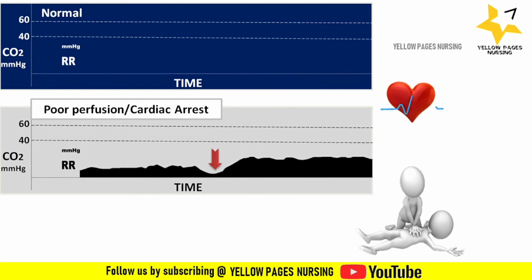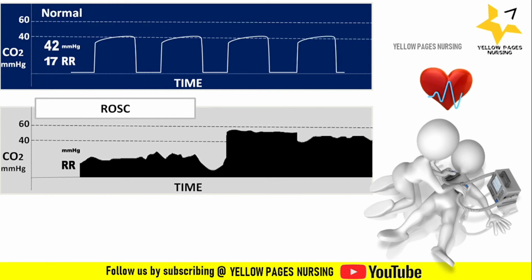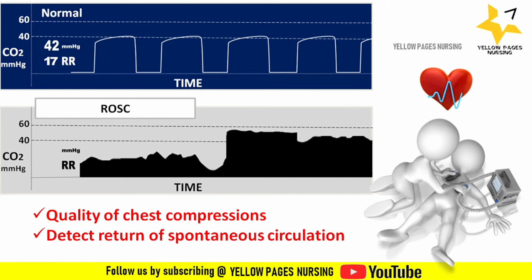Next comes the return of spontaneous circulation waveform. If you notice this image, there is a dramatic change in the EtCO2 after the patient has been defibrillated. Hence, using continuous waveform capnography can make a life-saving difference during cardiac resuscitation. Why? Because it indicates the quality of chest compression and it detects the return of spontaneous circulation without interrupting resuscitation. So, these are the important clinical waveforms a nurse needs to know.